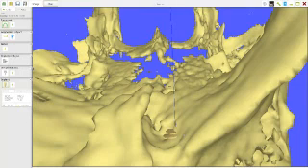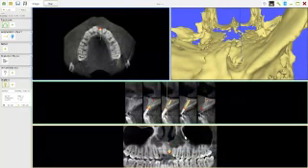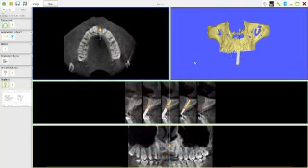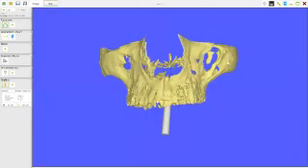So I'm going to click on the space bar again to get us back to this normal picture. If I want to go back to a normal size on there, I can just move to this little icon in the top corner there, click on that, and it sets everything back to normal as far as that picture's concerned. And then if I go onto there again and make it bigger, you'll see there's no teeth there.